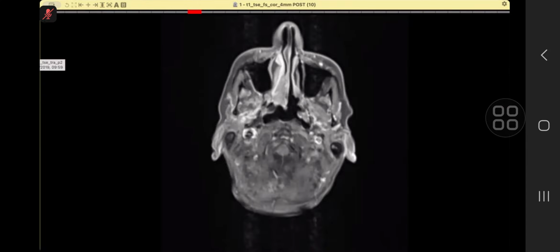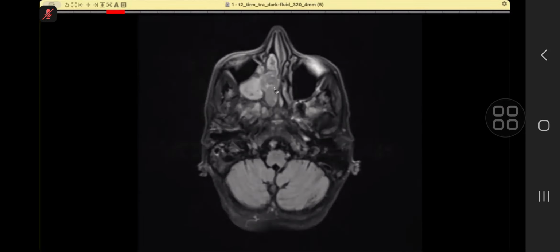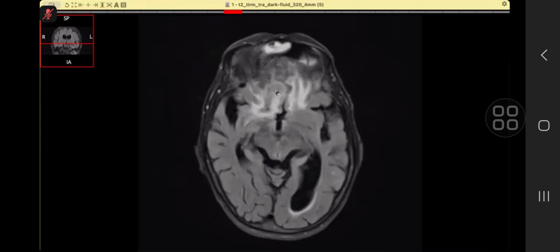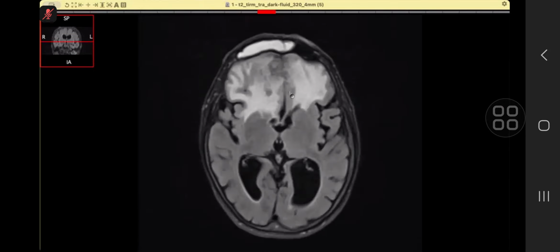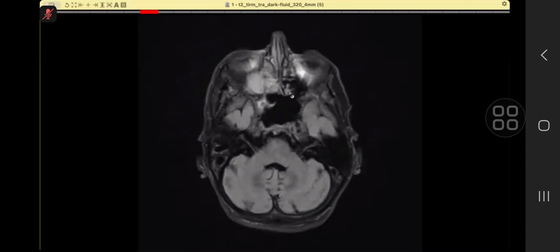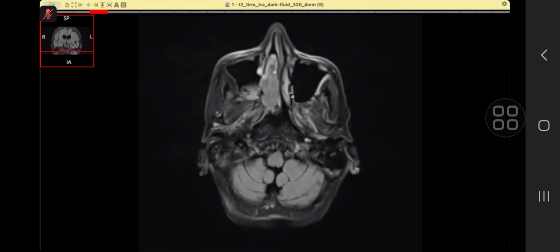And anatomy was the key here. You know what is happening, how it is going from here, even on this FLAIR. One point is that in your exam, think of what you do in your day-to-day practice: you will never make a diagnosis just on the basis of a non-enhanced scan, which is on a FLAIR. You will always do a contrast, ask for it.